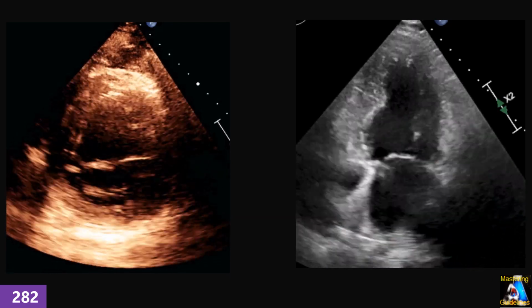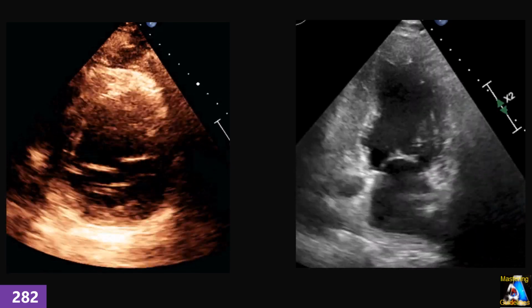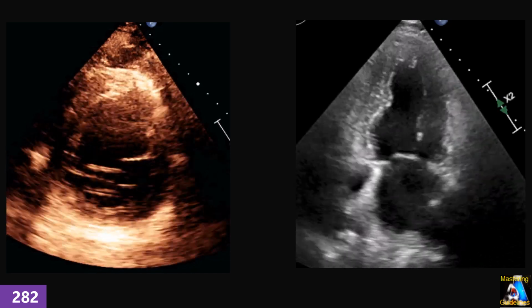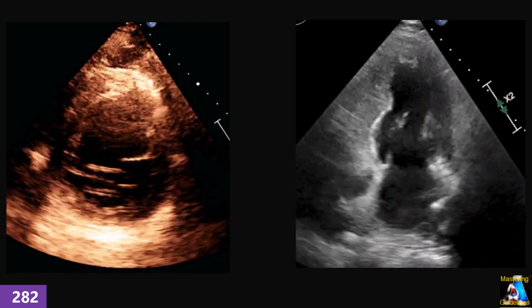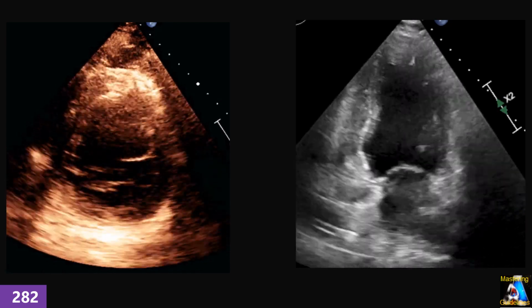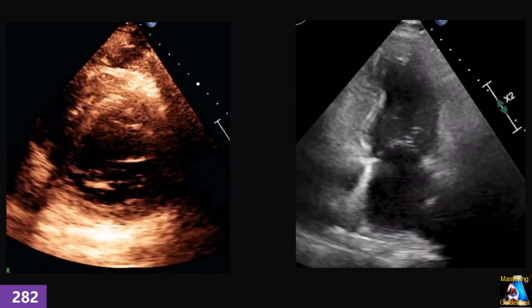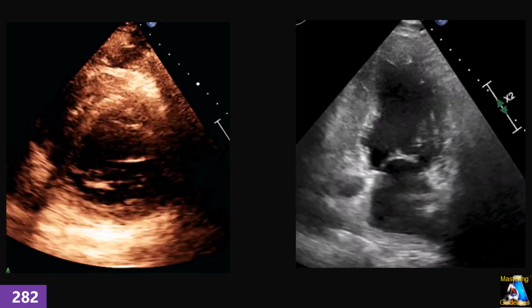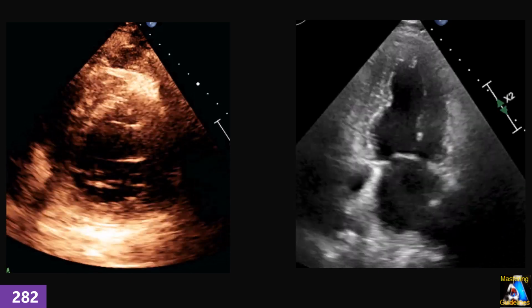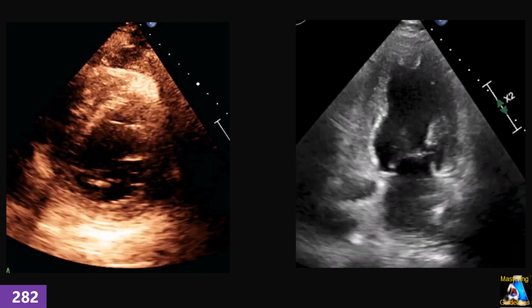If you can guess and diagnose correctly all those cases without any doubt, your knowledge, logic and understanding of wall motion abnormality is perfect, and you cannot miss anything. Now let's go see the explanation for this segment that I call the mysterious inferobasal segment.